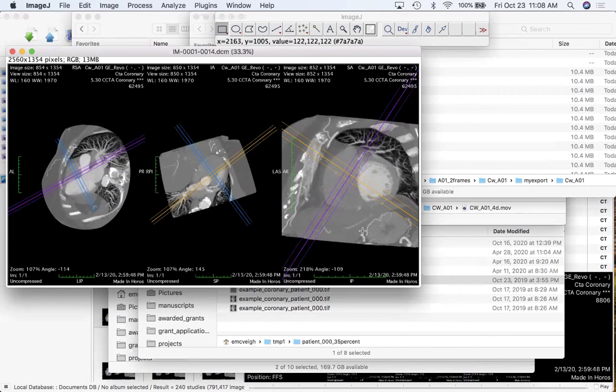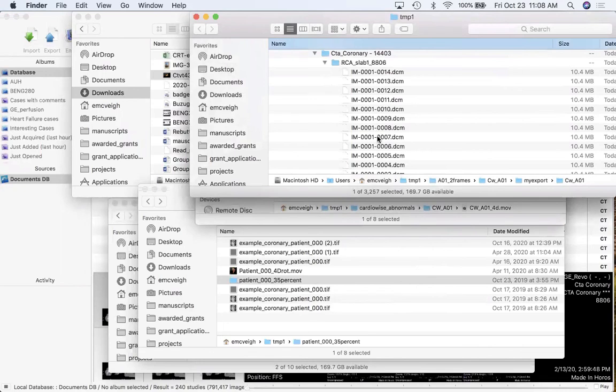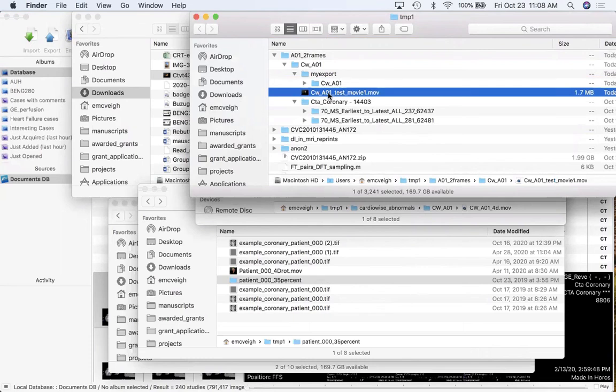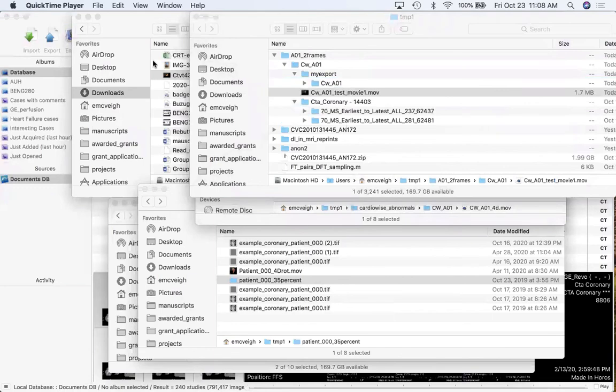I don't see any error, so okay. All right, so that's another way of quickly doing some analysis with that program, is to take the DICOMs that you saved. These can be read back in by Horos, of course, and then this movie you can just send in an email to your friends or whatever and look at what you've saved. Okay.